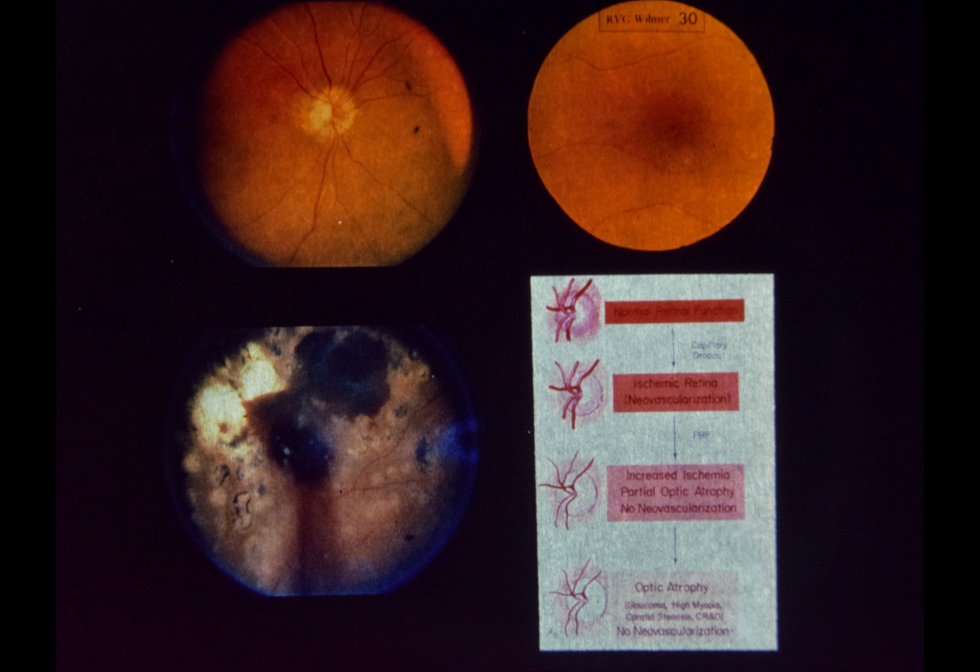Whether or not the theory as illustrated here is correct is a debatable point, but from an operational point of view, the scatter photocoagulation treatment is effective in many cases as shown by the results of the diabetic retinopathy study.